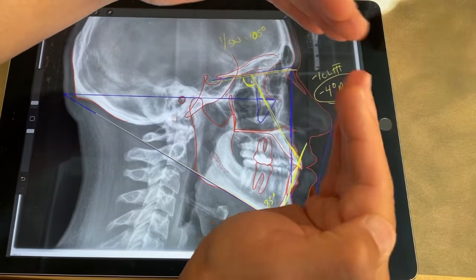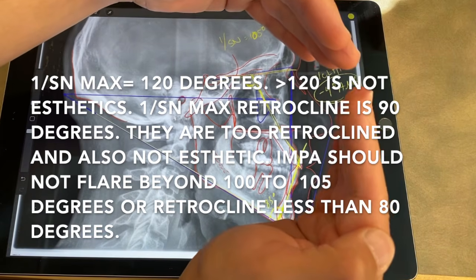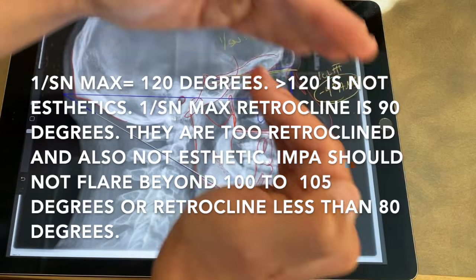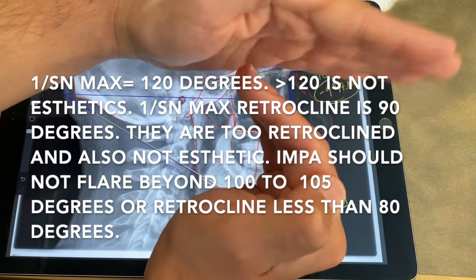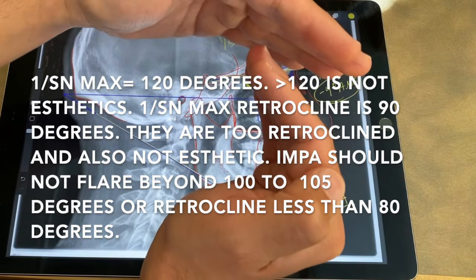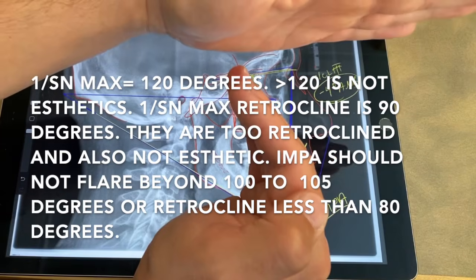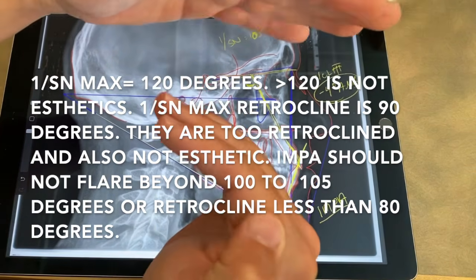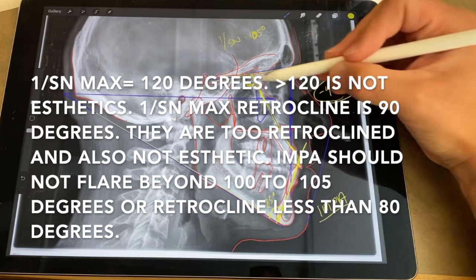A good rule of thumb is, think of blood pressure, 120/80. So 120 on the top, 80 degrees on the bottom is kind of the maximum you can get away with. Even that, the 120, the teeth will look pretty flared. But you can get away with it functionally and periodontally. But you can't just flare it to like 150, right? Or lean it back to 70 degrees. That's too much and you can start to see periodontal issues. So that's why those numbers are so important.